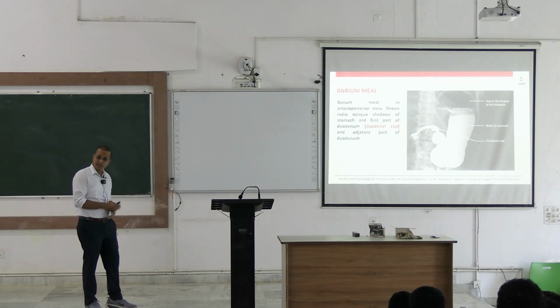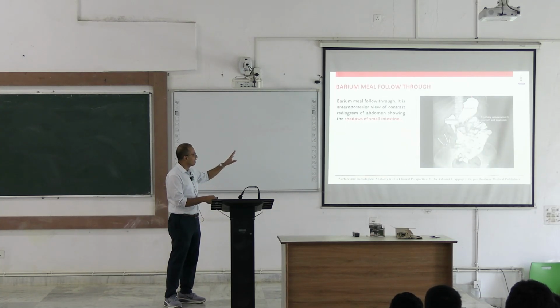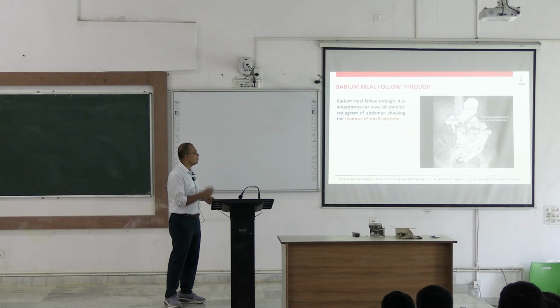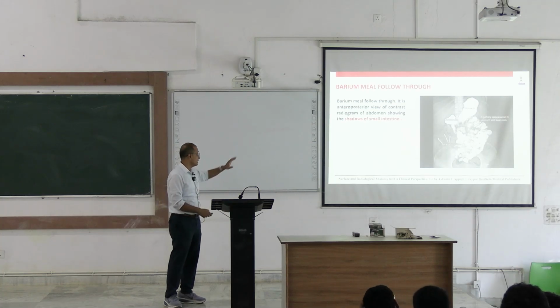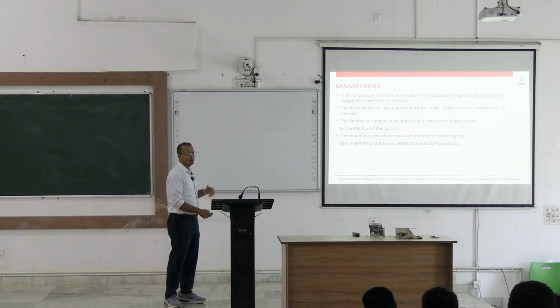What special thing are we seeing here? Here comes the special thing: out here is the barium meal. Coming to the barium follow-through, likewise, the same thing. Abdominal organs which can be visualized are the stomach and the interior of the small intestine, along with the bony shadows like this. So it gives results in two different regions, serving our purpose by giving primary attention to the interior of the organ along with the general shadows as well. This is what we call barium meal, barium follow-through.